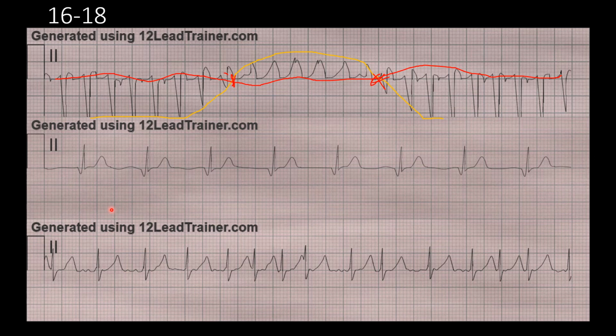That's alright. But the key thing here is when we look for our P waves, you might think there aren't any, and that might be the case, but I think there are, and these right here are actually inverted P waves. And some people might look at it and think that that's a Q wave. I just think they're P waves, and that comes from experience and the way they're all shaped.